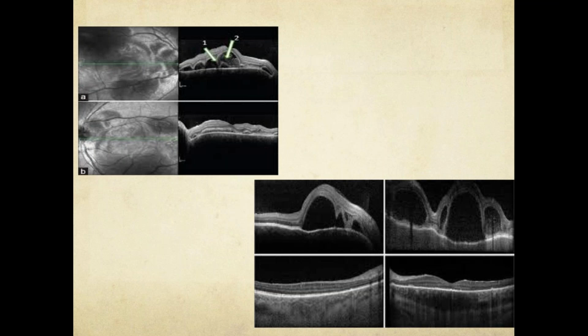Blood pressure is not under very good control. Okay, so that's one, hypertensive retinopathy. Not really, but okay, that's the retina.